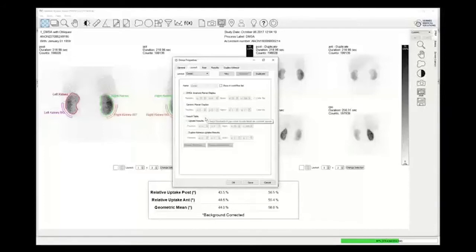This is a huge step forward in terms of configurability, and as I mentioned before, it allows you to optimize for your workflows and also optimize for your print output to PACS. So that's really nice improved custom processing environment.